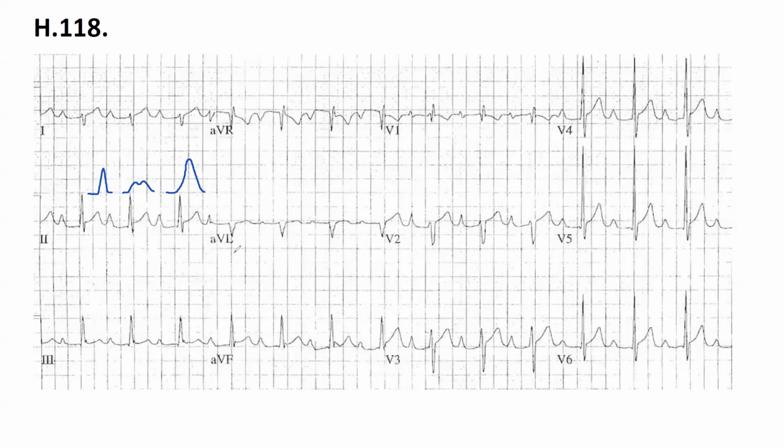It's a combination of these two, without notching, so both atria are enlarged. Exactly. So it is a biatrial enlargement. So if you see a peaked, wide P wave, you have to assume that both atria are enlarged.